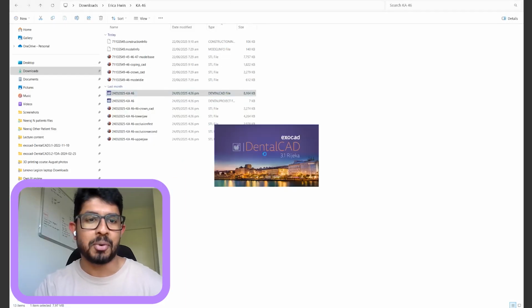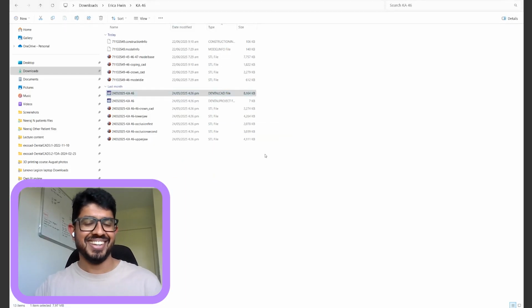I just wanted to show people, in terms of the emergence of that crown, what it would look like in your case. Let's go ahead and open up what we had. Again, beautiful design, no problems with the design. I just wanted to talk about the margin adaptability. No comments here. Yeah, no, go for it.